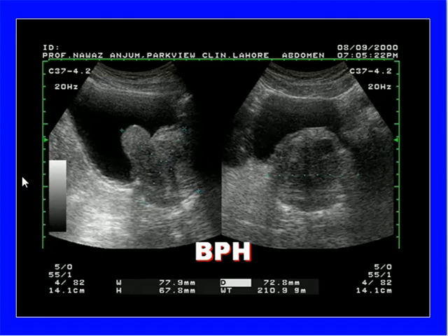Ultrasound picture of the benign prostatic hypertrophy. In this case, there is enlarged median lobe. Urinary bladder is filled, showing wall thickening, resulting in chronic hypertrophy of the wall because of the presence of the benign prostatic hypertrophy.